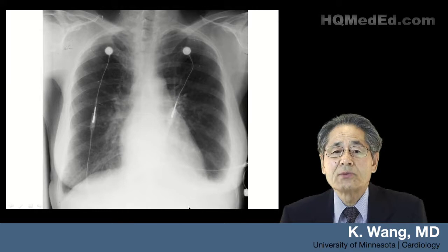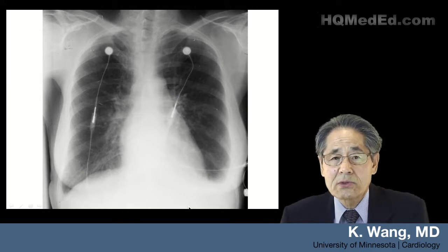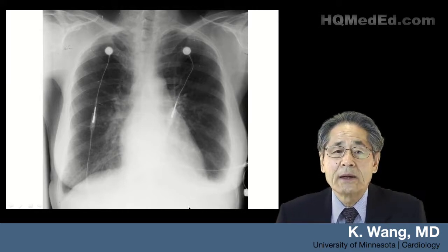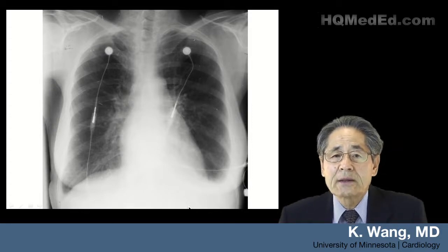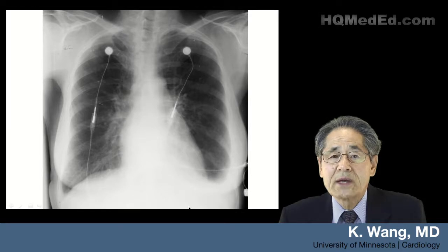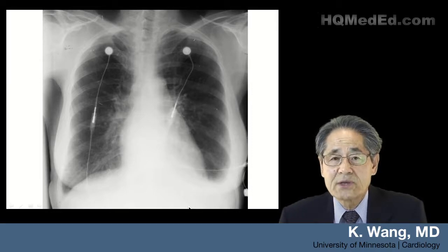This is an interesting patient that I dealt with a while ago. This patient came to me with dyspnea on exertion. And the story tells me that it is cardiac because she has no anemia or chest problems or chest deformity or lung problems. So there was no other reason for her to have dyspnea. So it is cardiac.